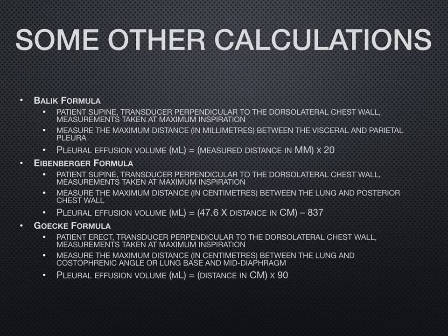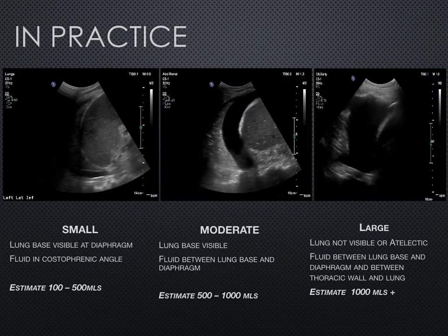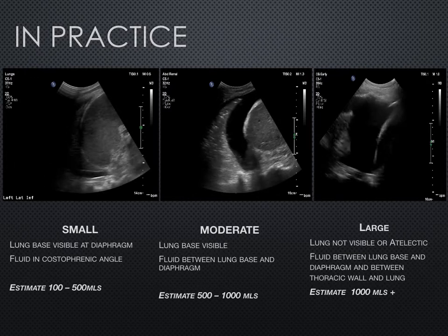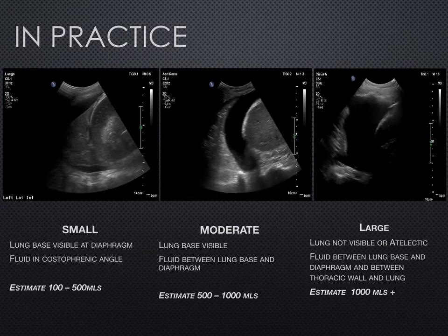I would say probably in practice, most of the time, calculations are not necessary or probably worth your time, I would argue. In practical terms, one of the most recommended methods is just eyeballing the volume of fluid that you would think is within that thoracic cavity.